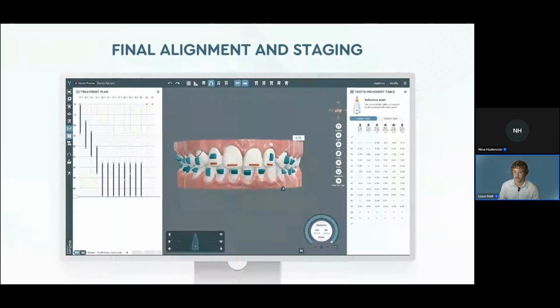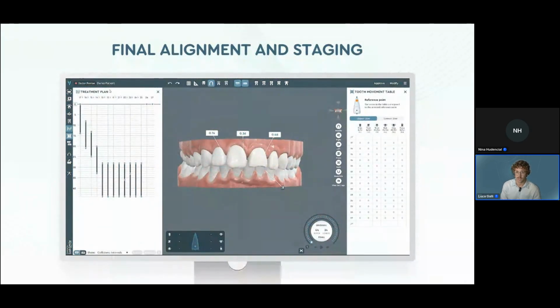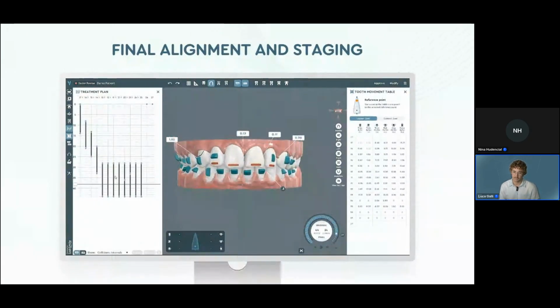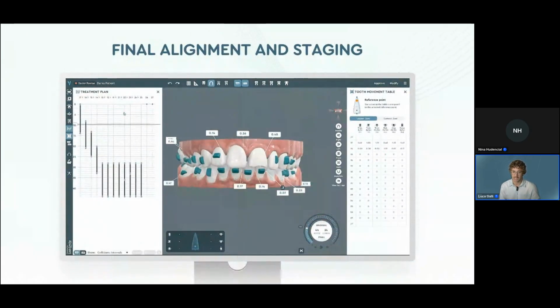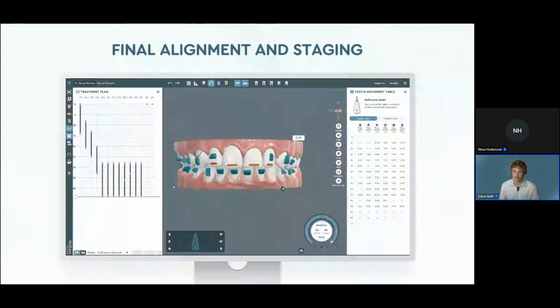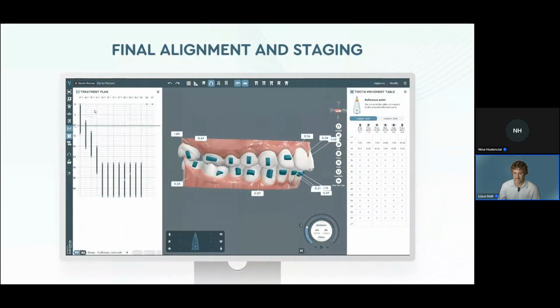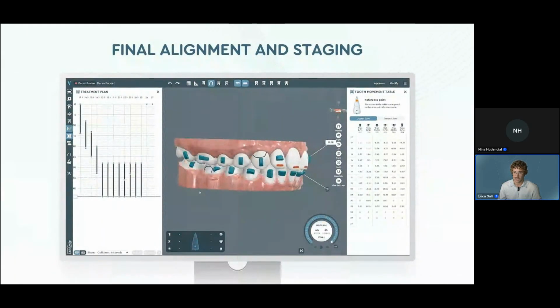First, from the frontal view, you'll see we start with a control expansion on the right side while keeping the upper anterior segment locked. The idea is to build stability first so we don't lose anchorage when the bigger movements begin. Then switching to the right sagittal view, we move into upper posterior distalization using a half-step protocol that keeps the movements more predictable and reduces the risk of pushing too much too fast.